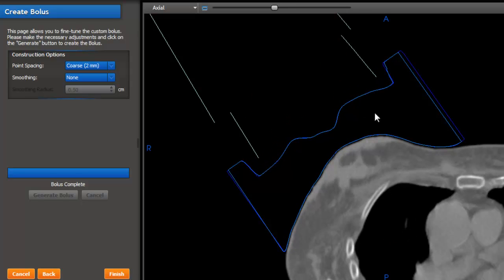What you will notice on occasion, the edges of the bolus may not be perfectly represented. Remember, we used a 2 millimeter grid spacing, so the distance between this end and this end is typically going to be less than that grid spacing. It just means there was no intersections between this and the next point in our grid. So anywhere down, we never intersected the bolus, so we kind of lost that last millimeter or two on the edge of our bolus.